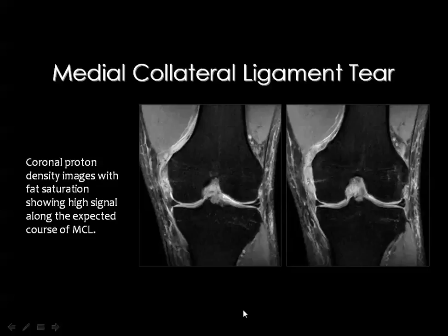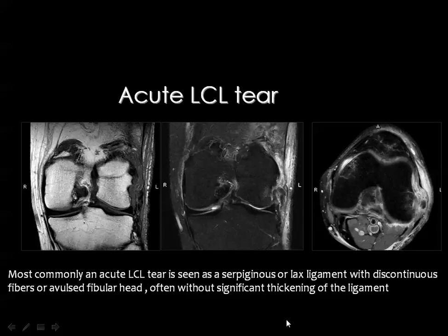Medial collateral ligament tear. You look in the notch here, and this is the medial side of the knee, and this is the supposed course of the medial collateral ligament, which is not seen along its whole course and is replaced by fluid signal diagnostic of its rupture.